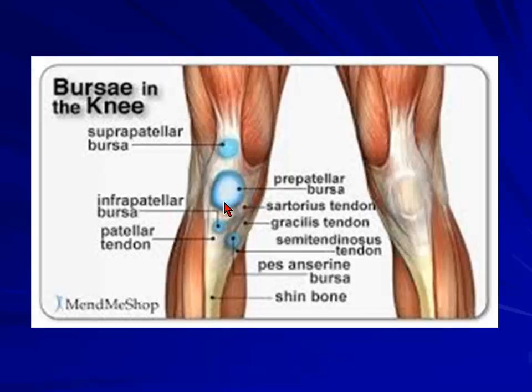So if you've got avulsion, you'll see some bruising over the tibial tuberosity, and that will reflect infrapatellar tendon avulsion injury. You have bursa again. You've got a muscle. Underneath that, you've got the femur coming down. So just the space there, that's the patella. So just superior to the patella is a suprapatellar bursa.